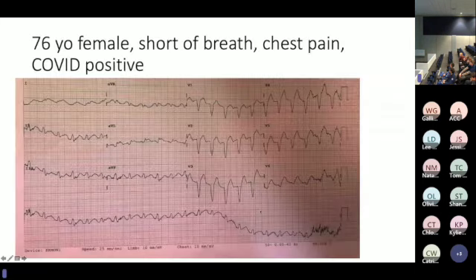And then this is the last ECG. This was a Bankstown patient who presented with COVID, with shortness of breath and chest pain, and this is the ECG that you find. What's that?